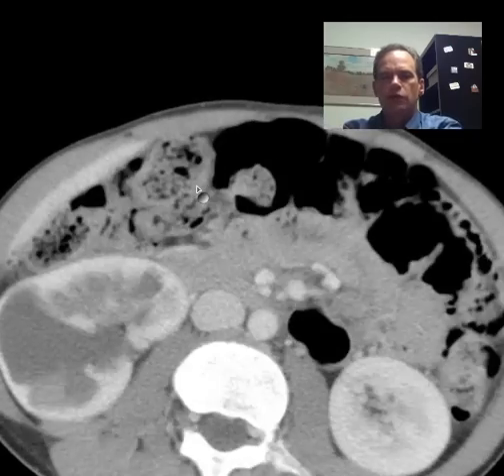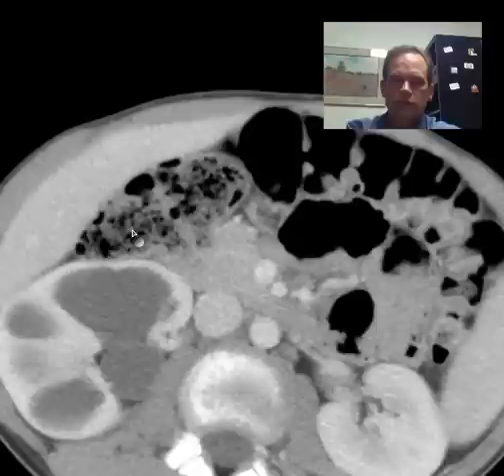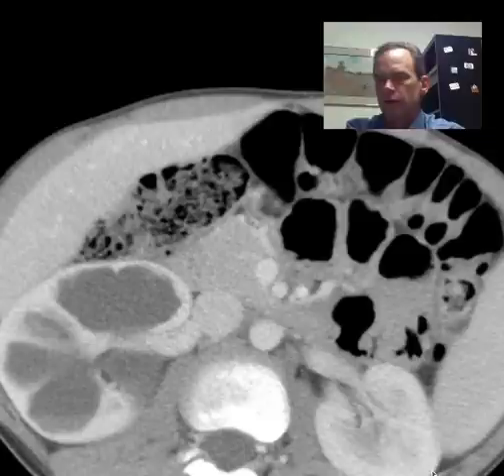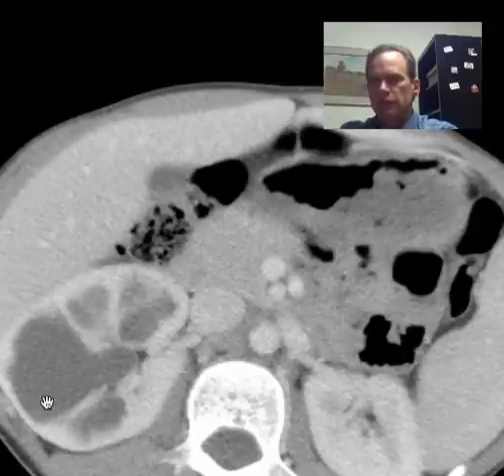And so it's surrounded by fat to one extent or another, and those spaces, the perirenal and pararenal spaces, are extremely variable. This person has just about none of either. They're thin, and they've taken a lot of the fat away from that area. But other people, many people that you see on the street and in the ER these days, are going to have a much more copious quantity of adipose, and there'll be plenty of fat around the kidney to get infiltrated.